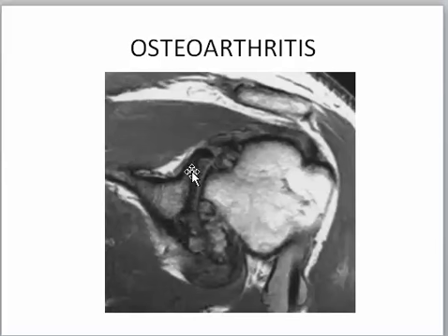There are marginal osteophytes, there are subcortical pseudocysts, there is definite narrowing of the joint with resorption of the cartilage in between, and there is a large capsule following the new bone formation here, and the sclerosis seen by this low intensity. So all these are the components for osteoarthritis of the shoulder joint.